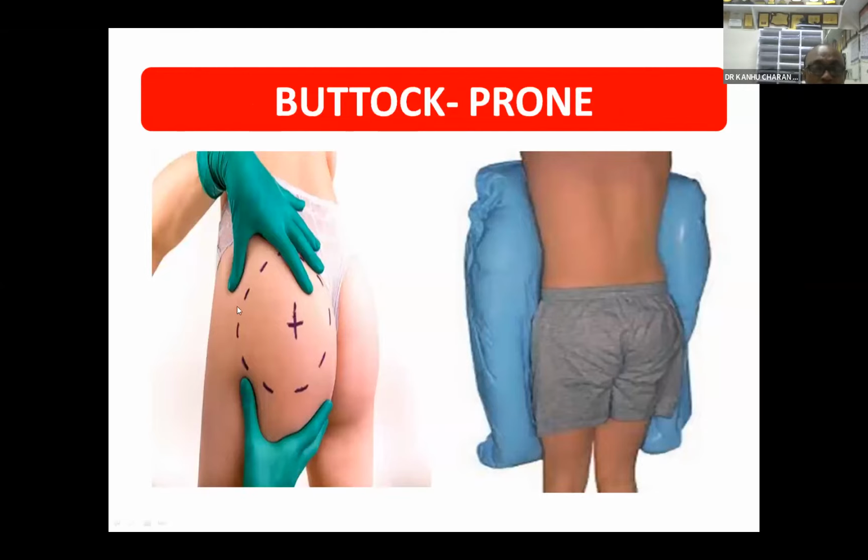And if you are treating the buttock, always take the prone position, and that will be fine to decrease the dose to the anterior abdominal structures. And prone is the best thing we can go for the buttock areas.